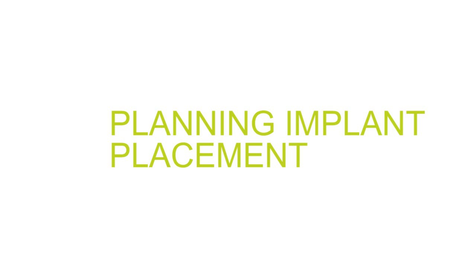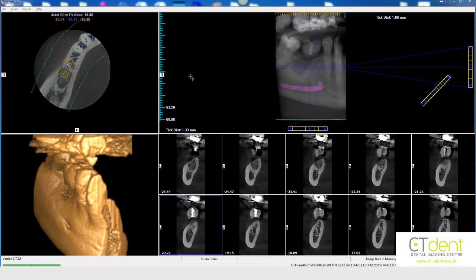Planning implant placement. This video will show you how to use the iCAT Vision software when planning to place an implant. Once you have the patient scan open, select the implant screen. In this screen, you will be able to visualize the available alveolar bone and important anatomical structures.